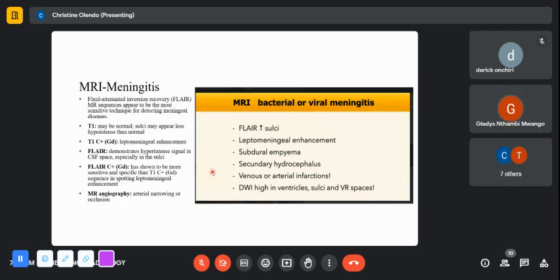So the abnormal collection will be brighter in FLAIR compared to T1 with contrast. Because FLAIR will only null fluid that is of CSF quality, right? Yes. So if there's any small alteration in the CSF fluid in terms of increased protein, then it will not null, and that way it will be much easier to pick it. And that is why FLAIR with or without contrast will be able to pick up the meningitis.